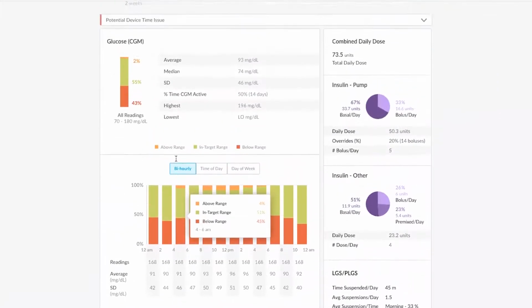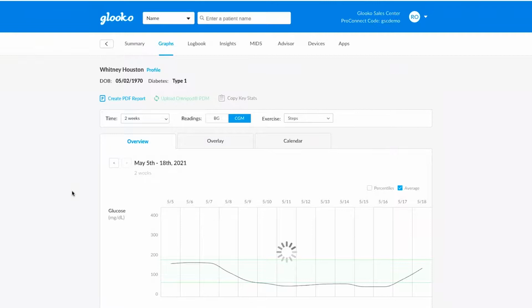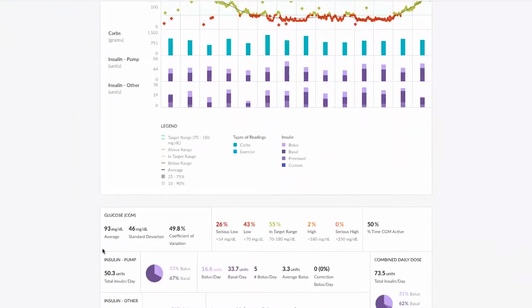Lastly, if the patient uses the free Glooko mobile app to sync their diabetes device in the comfort of their home, the population tracker will also display this data, allowing the care team to remotely monitor how the patient is managing their diabetes in between the patient's appointments.